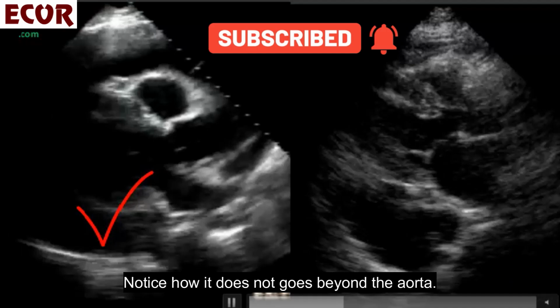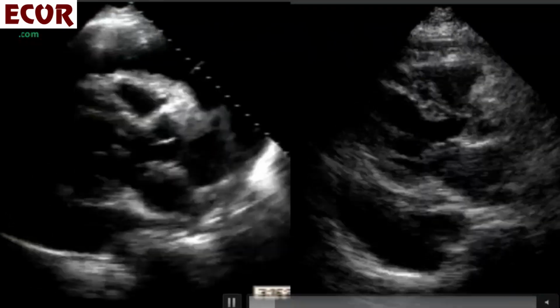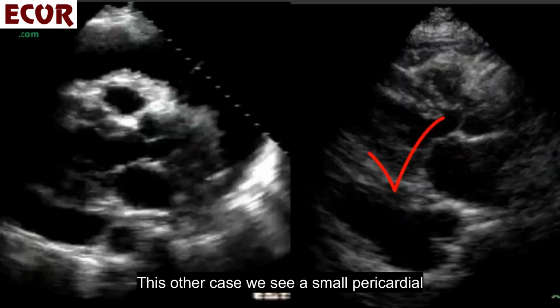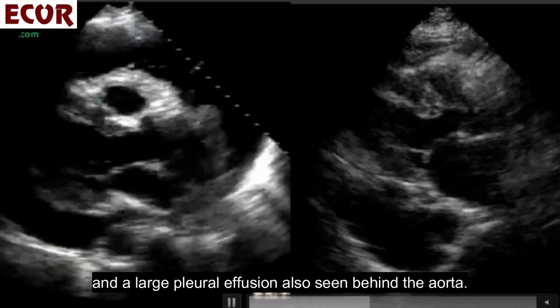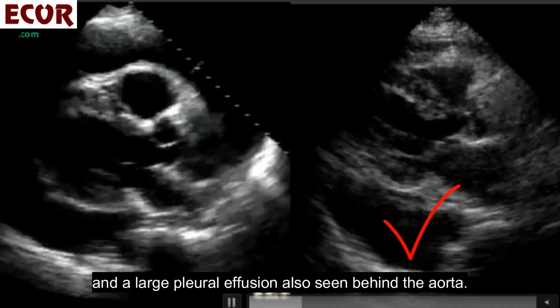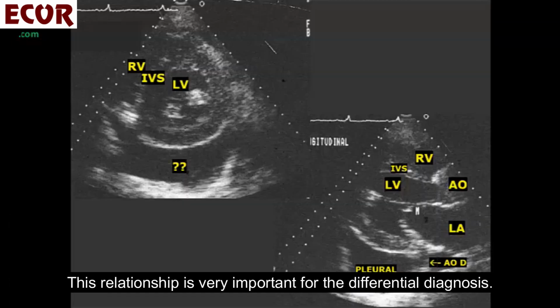Note how it does not go beyond the aorta. In this other case, we see a small pericardial effusion since it is in front of the aorta, and a large pleural effusion also seen behind the aorta. Relationship is very important for the differential diagnosis.